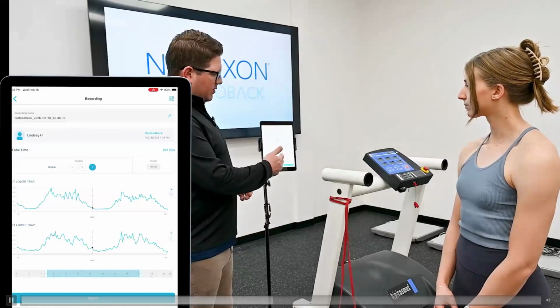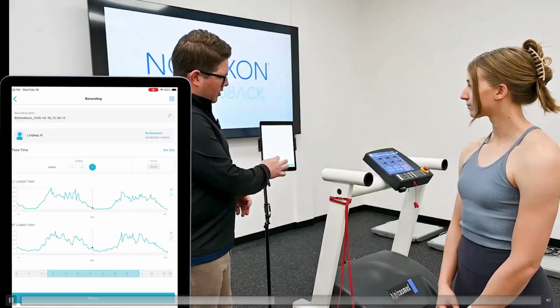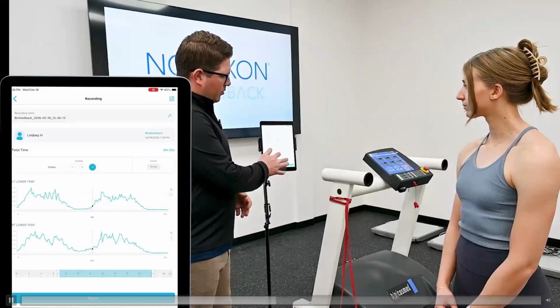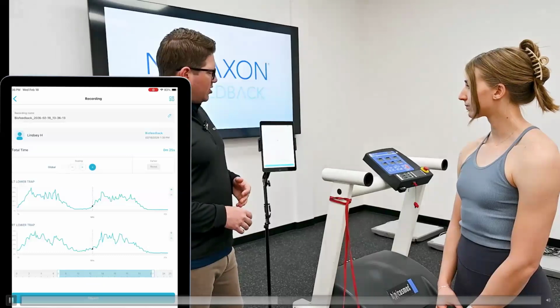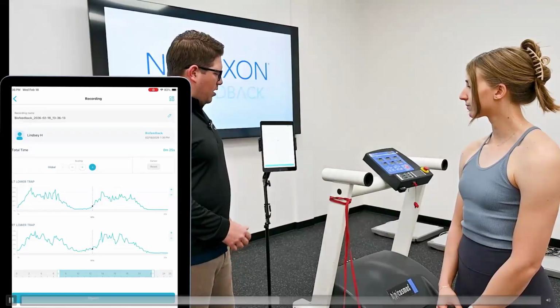In this case, it just gives us the ability to dive into the signals so we can see the activations that were happening. We have the ability to adjust the cursor to really pinpoint certain levels of activation. We can play around with the scaling here as well.